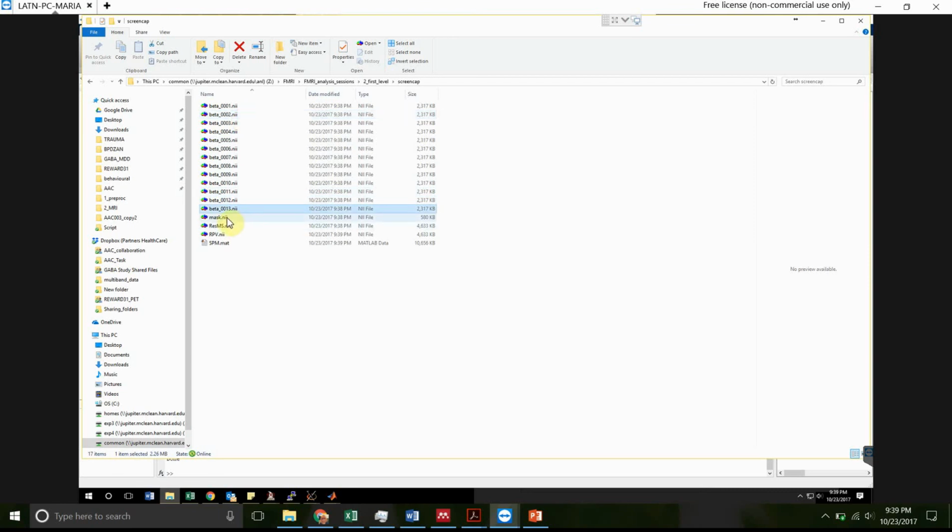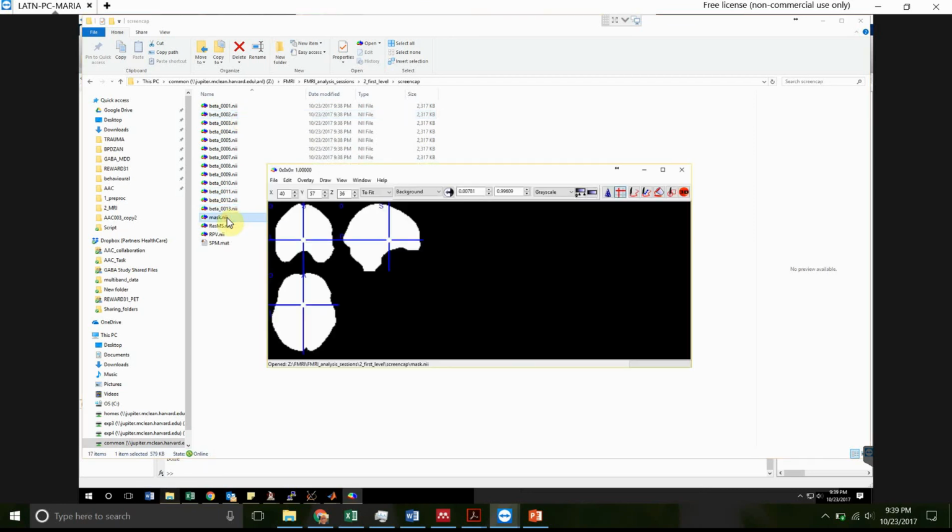What it also produces is a mask image, which you can just open and look at in MRIcron, where you can see which voxels were visible for this person. So you can see your dropout in the orbitofrontal cortex here. And we can do some remasking on that, which I'll show you at a future date. You can see the dropout there, which is different depending on where someone was lying in terms of their sinuses in relation to the magnetic field.